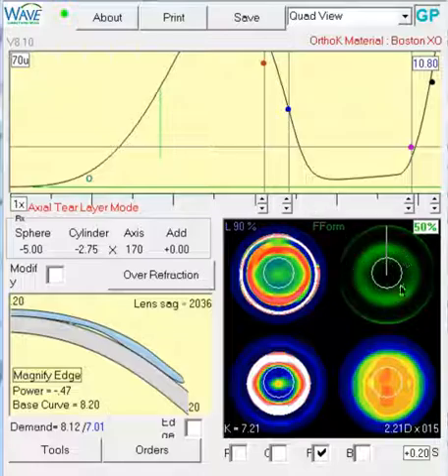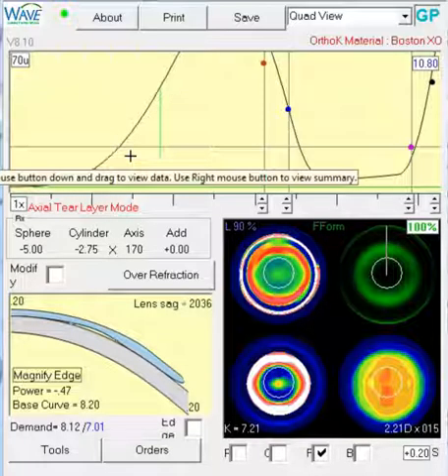And you can see in the graphic now the optic zone is oval. This does kind of counteract some of the increase in size of the treatment zone, but if we need to correct the refractive error, then we don't have too much of a choice. Keep an eye on the post-wear refraction. If the patient is still overcorrected in 100% mode, it's not difficult to just back off on demand, and that helps increase the size of the treatment zone as well.